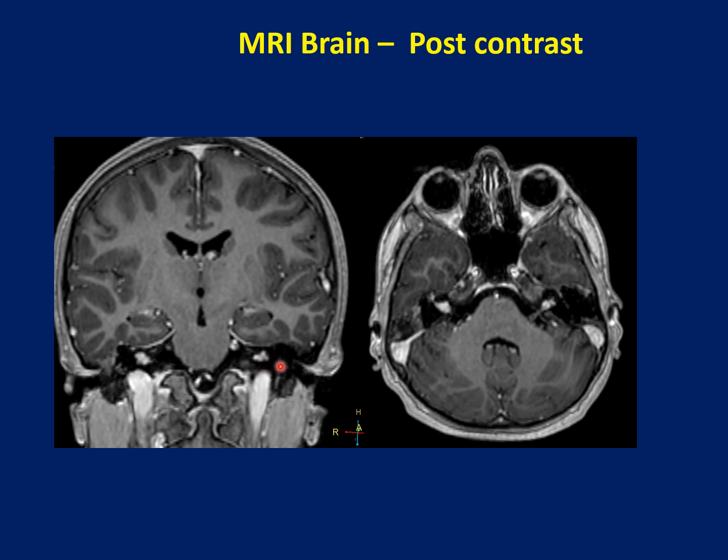This is an abnormal enhancement. We never usually see any enhancement which is seen within the 7th 8th nerve root, nor do we see any enhancement of the cochlea or the vestibule. So this is an abnormal finding. The reason why we see this abnormal finding is because that there is an intralabyrinthine and an intravestibular schwannoma which is present in the bilateral 7th 8th vestibulocochlear nerve complex.